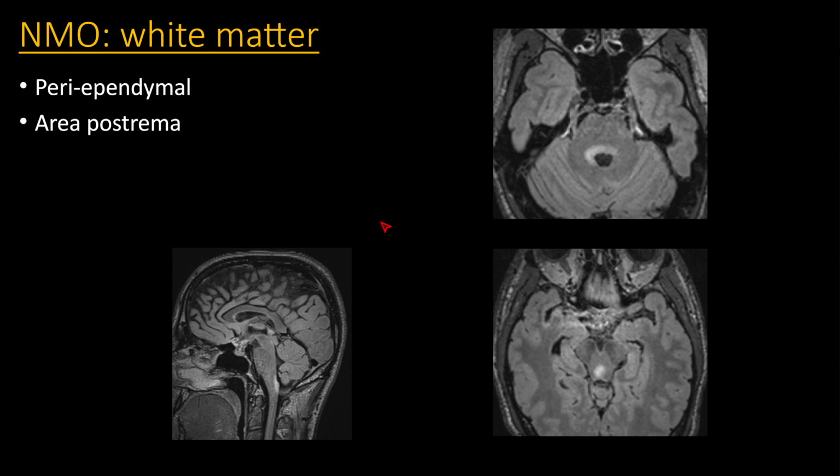Whenever I'm classifying a white matter lesion, if I see that lesion touching the ventricular surface, I would call it a periependymal lesion. If I had a thalamic lesion touching the third ventricle, I wouldn't call it periventricular, because in the setting of MS, as we talked about, periventricular means abutting the lateral ventricles. However, I would use the term periependymal lesion because it is touching the ependymal lining of the ventricles, and that term implies to the neuroimmunologist that this patient could possibly have NMO.